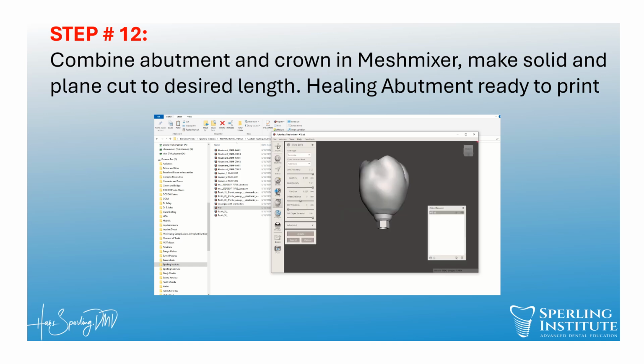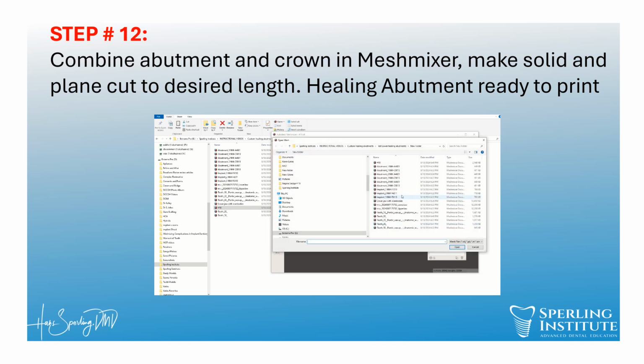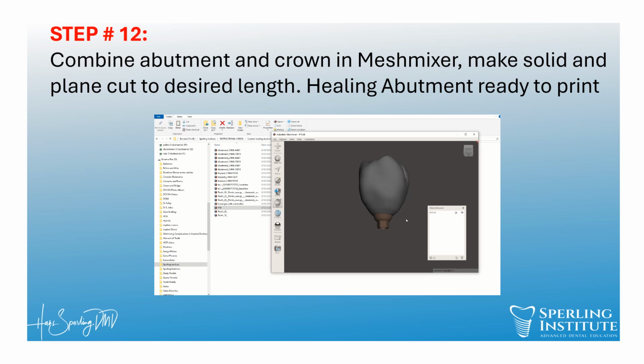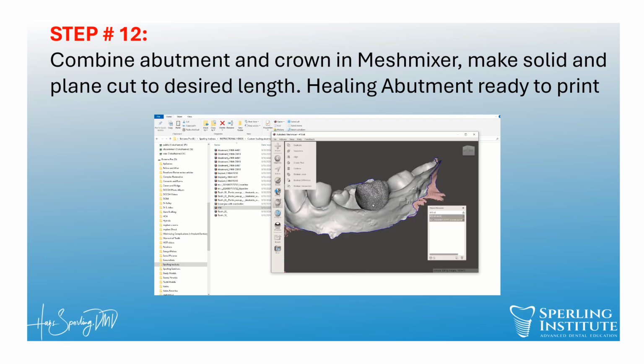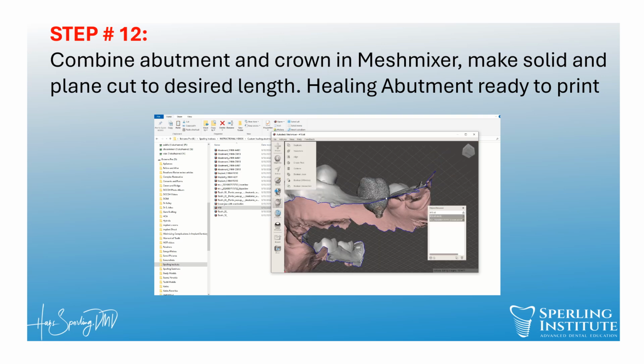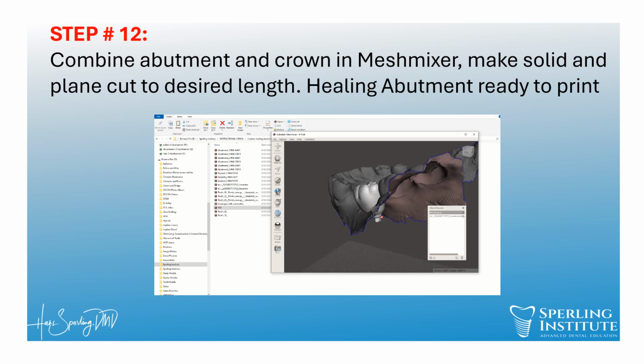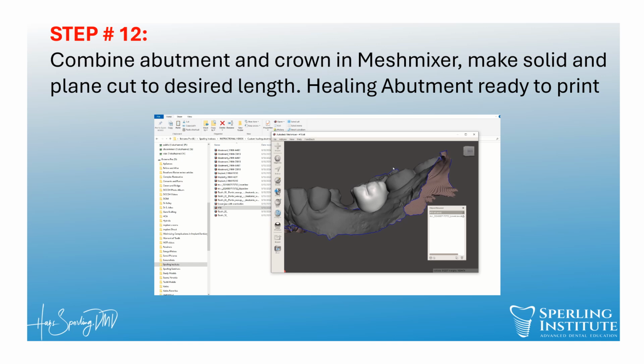that. What I'm going to do is I'm going to import my jaw model. And I'm going to perform a plane cut to the level of the gingiva.